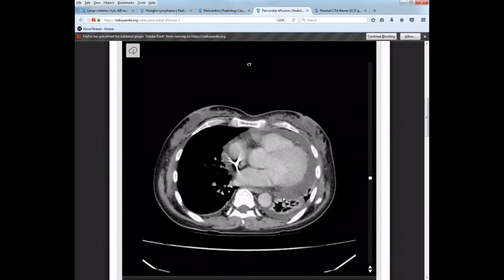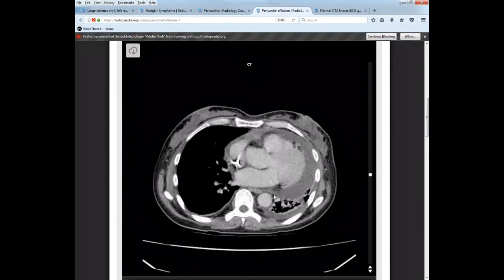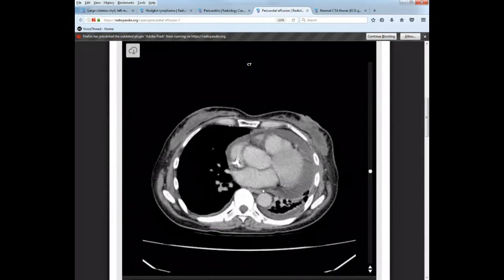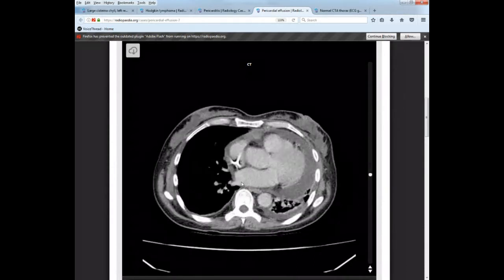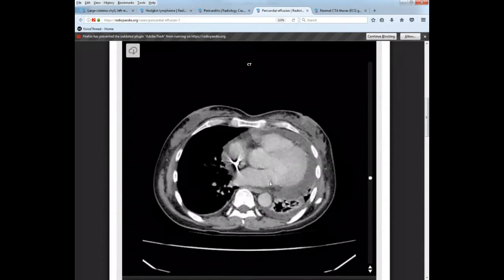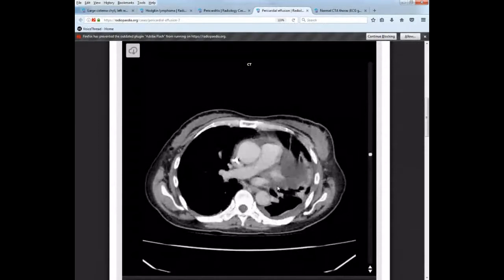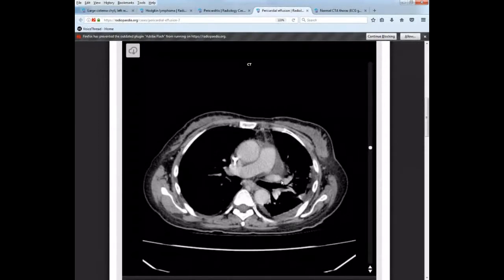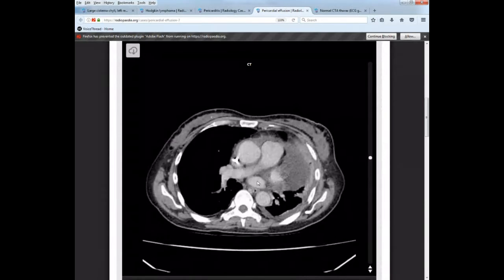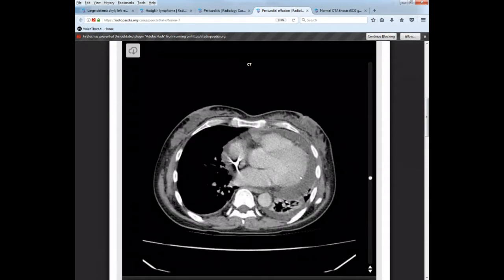So now we need to look at our blood flow coming back into the heart from the pulmonary veins, which you can kind of see here. Inferior is located posteriorly. Anterior, or the superior, and then the other one, it's hard to see without any contrast there. Here. Anterior, superior, dumping into the left atrium. Left atrium dumps into left ventricle, this guy right here.